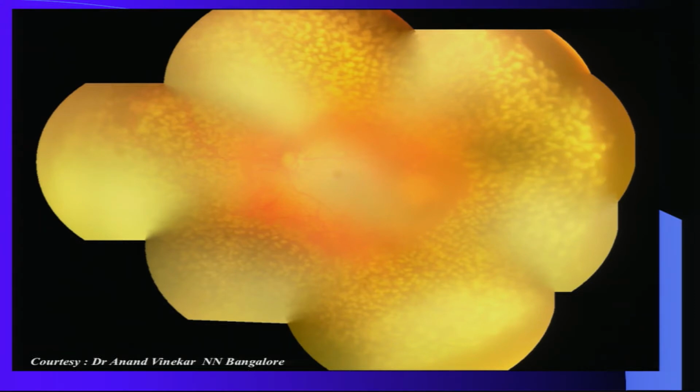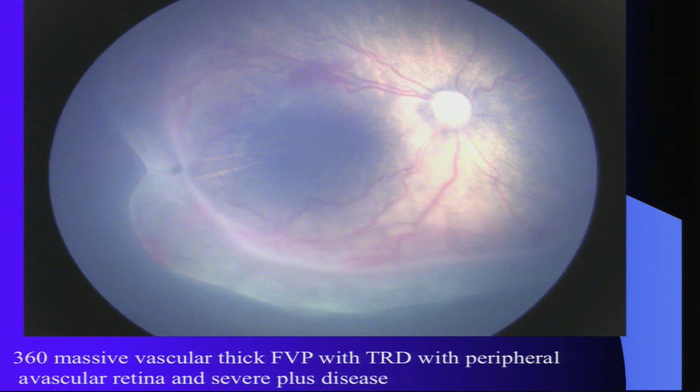This is a picture Anand has given to me. And you can see here, you can have a nice montage for demonstration of all areas. And even a video is possible, which I'm not going to show you here. I'll just demonstrate one case here.